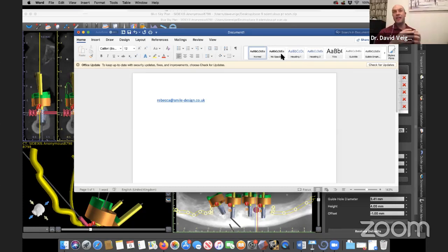So it's like a silicone key, the same silicone key that was used at the time of the CT scan, which will then be used at the same time as the surgical guide positioning.